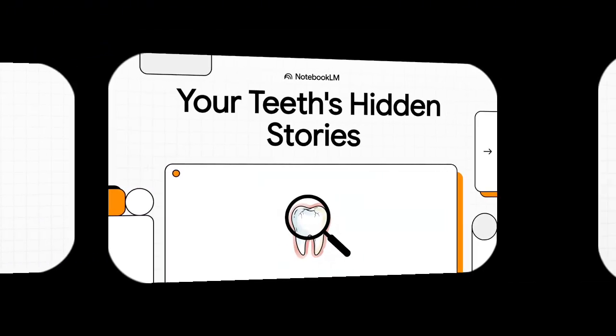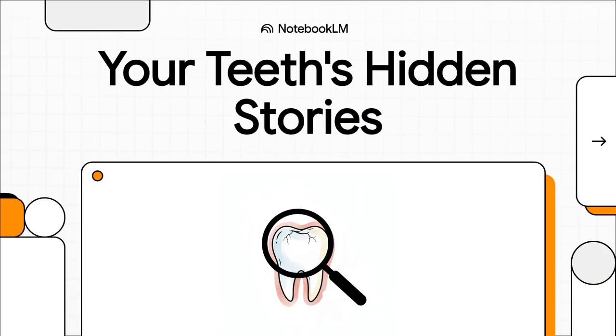You know that moment? You're sitting back in the dentist chair, you see that big X-ray machine swing over, and you just wonder, what is it really looking for? Well, it turns out your teeth have all these hidden stories to tell. We're talking about cavities that are just getting started or trouble brewing deep under your gums. And today, we're going to learn how to read those stories.